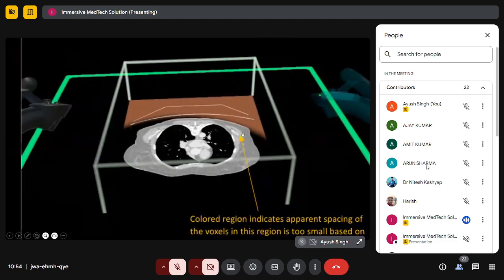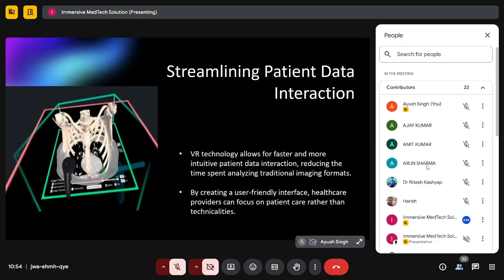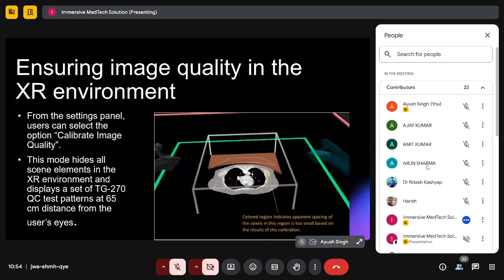So this voxel gap allows us to further modify and configure the segmentation, where we can directly work on the smallest of the parts. So no feature gets missed while we are using this sort of approach, wherein we can calibrate the data set according to the specific requirement.